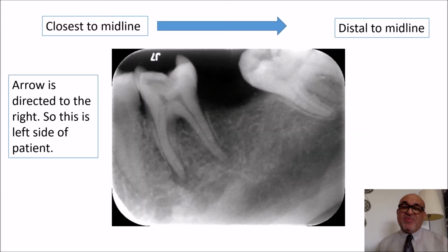Again, mandible. How do I know it's the mandible? This is the inferior border of the mandible and the bone trabecules, and this is the 5, 6, 7 is lost, and the 8 with an extra root. Again, those extra roots in the mandibular teeth are an exception.